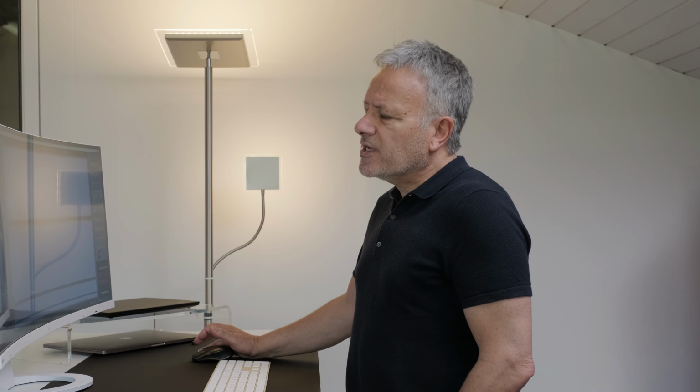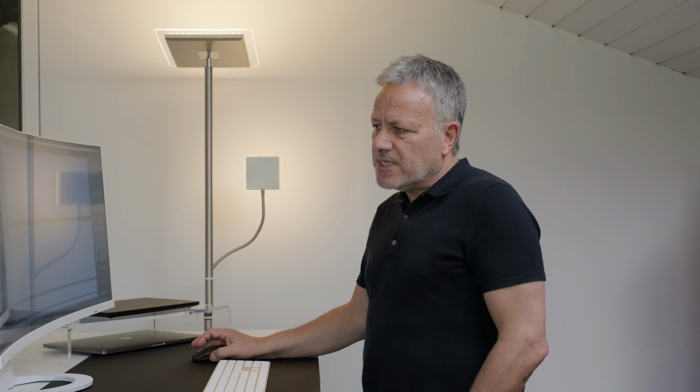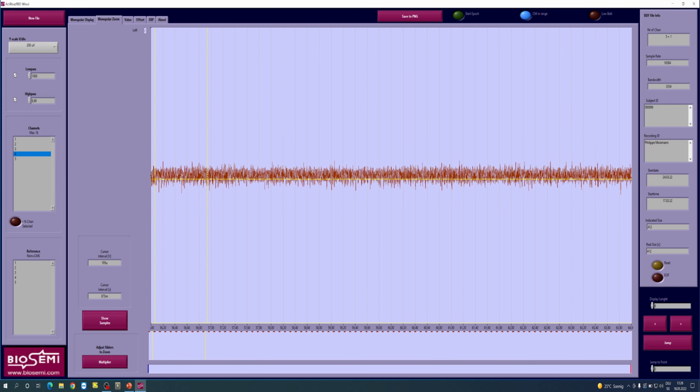Remember, we actually have an input on the USB receiver of 16 bits. However, we only use a single first bit as our trigger marker number 1 from the stimulation system called the Surpass from EMS. Now, we see the little trigger marks on the bottom here, these brown little guys here.